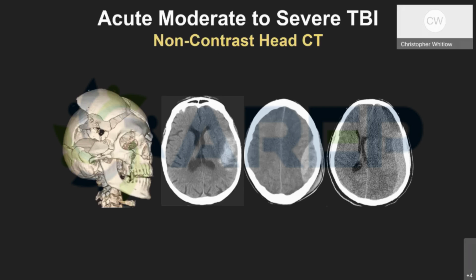But beyond simply identifying intracranial abnormalities, there's evidence that non-contrast CT is sensitive for identifying intracranial injuries resulting in death and/or requiring some kind of neurosurgical or neurologic intervention, intubation for greater than 24 hours, or admission for 2 days.